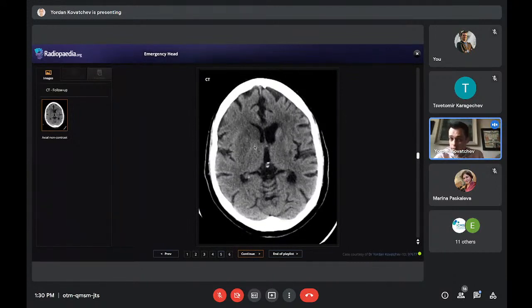I mean, it's inevitable. The patient was treated, but still there will be some deficit. And there is some mass effect you can see on the frontal horn, initial positive mass effect, because if you scan this patient in 6 months or 1 year or 2 years, we will see that this area here that is infarcted will have lowered its density and lowered its mass effect.